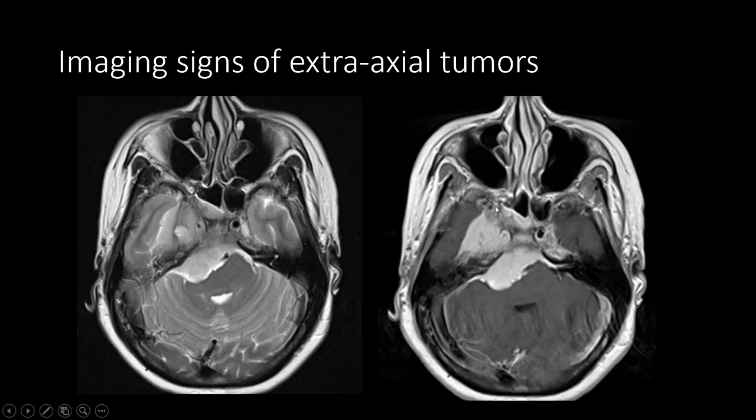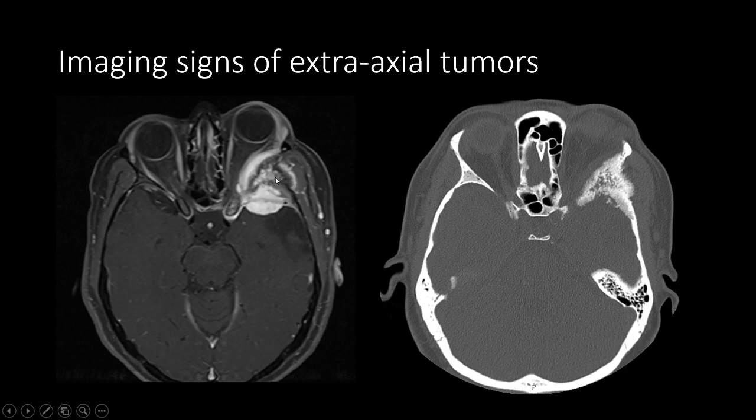This is another skull base meningioma at the petroclival synchondrosis with cavernous sinus involvement. We can see that the encased right internal carotid artery flow void is markedly narrowed. This compares to the normal caliber of the contralateral internal carotid artery. Here is an intraosseous meningioma centered on the left greater sphenoid wing. Note the extensive hyperostotic bony reaction. The tumor has extraosseous extension into the lateral left orbit and into the left middle cranial fossa.